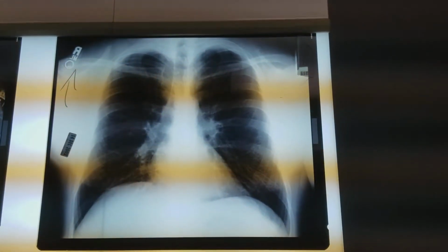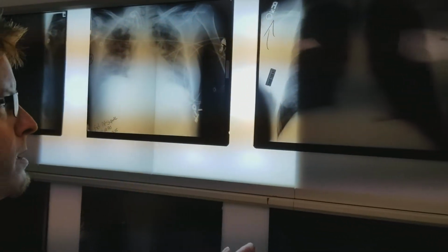And so what that's going to run us into, I'm going to try to keep the lights down a little bit because the imaging is tough on the camera.